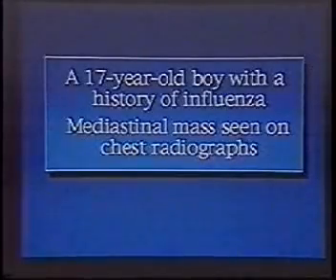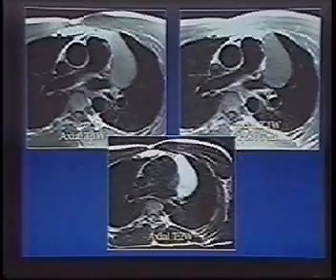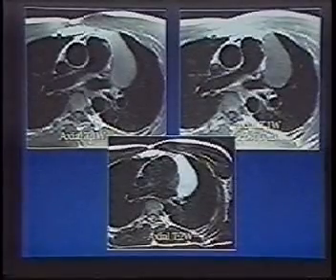Okay, so 17-year-old boy with a history of influenza, and chest radiographs were performed to assess for the possibility of pneumonia. We saw a mediastinal mass on that chest radiograph.